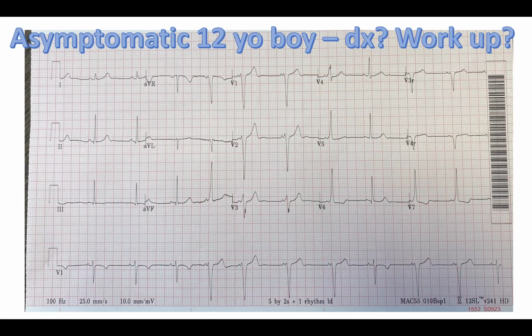Now, here's the interesting thing. This same patient had a ZO patch and had 1-to-1 preexcitation up to 187, maximal sinus rate on that 48-hour tracing. And so, it should give some insight into the fact that a lot of this non-invasive stuff is hard to interpret.